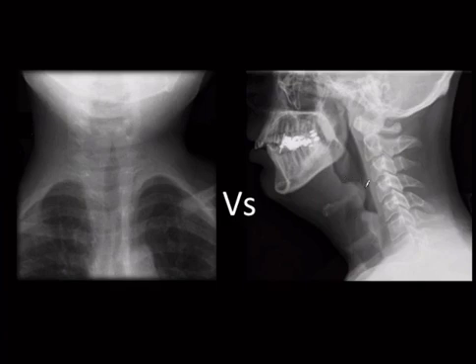First place to look is here, because that's the most obvious. It's the epiglottis. The next thing to look at would be if these prevertebral soft tissues are too thick. And then you're thinking like abscess, and you want to recommend a CT. Other things they could show you would be big tonsils, or a bunch of frothy stuff in the trachea, like an exudative tracheitis. Lastly, and probably the most unlikely, would be a foreign body.